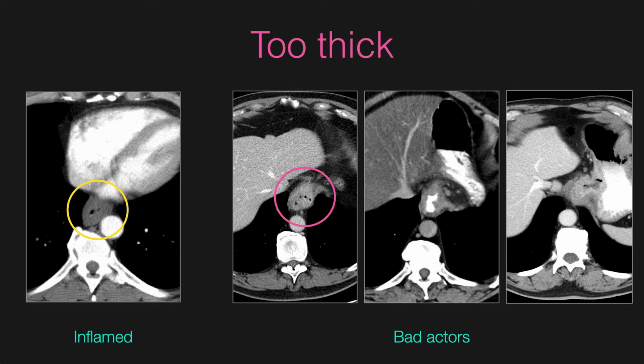In this first example, it looks a lot like a hiatal hernia. Oral contrast in this second example helps us to be more confident as it displaces the intraluminal air and helps us to appreciate the soft tissue thickening of the wall. And finally, large masses at the gastroesophageal junction with surrounding adenopathy are easy enough to spot.